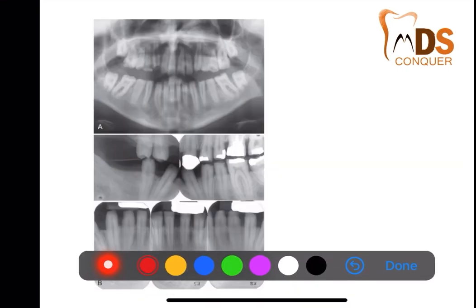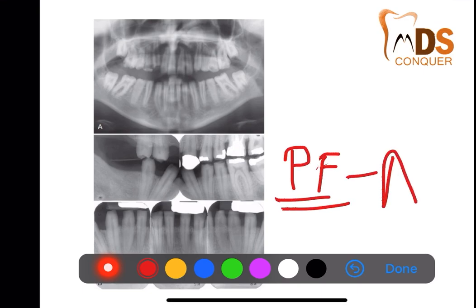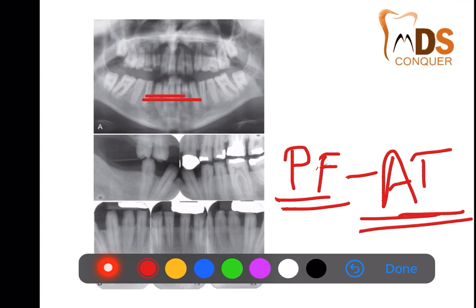Next, coming to the very important radiographic finding, we have gone through this in our daily discussions. This is nothing but the picket fence appearance, which is seen radiographically with the hypoplastic type of amelogenesis imperfecta, because there is loss of enamel, because of which there will be loss of the contact points. So if you see, the contact points are not there, and that is giving the picket fence appearance, which is clearly appreciated in the anterior mandible.